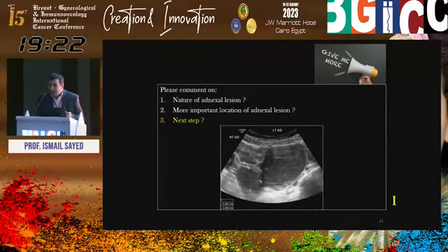Yes. Another case with the same etiology, with the same pattern. 2 cysts, low-level internal echoes, classic endometriomas. But ovaries now in abnormal location, posterior to the uterus, kissing each other. This is exception of the rule. Yes, ovary in abnormal location, but containing endometriomas, no acute pain.